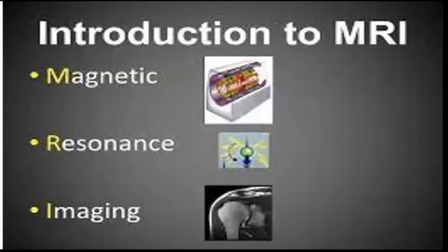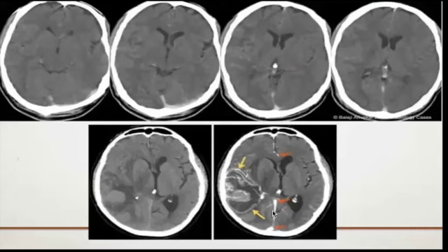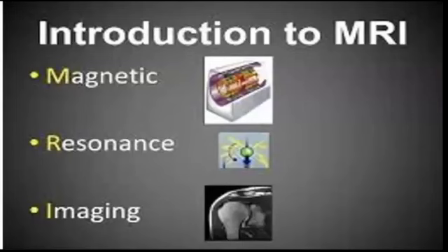However, I think that up until now, from my current understanding, you will just be asked to identify the image, like what are you looking at? So this is an axial brain CT, and then you should be capable of saying, oh, so I see here there's a mass and there's a midline shift, and probably that's more than enough. You don't need more than that. Okay.